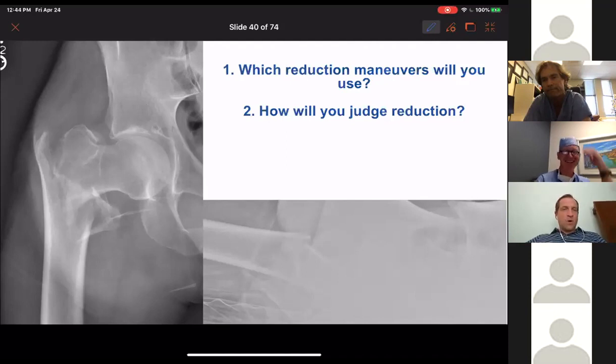So hard. There's such a lack of radiographic clues. The shaft is almost always externally rotated just because you look at it on the fracture table, but how much it needs, when it's reduced rotationally based on the fragment appearance, it's hard. Sean, Tom, anything? Paul? Yeah, welcome to my cluster.